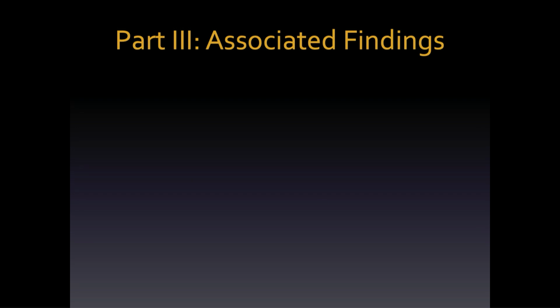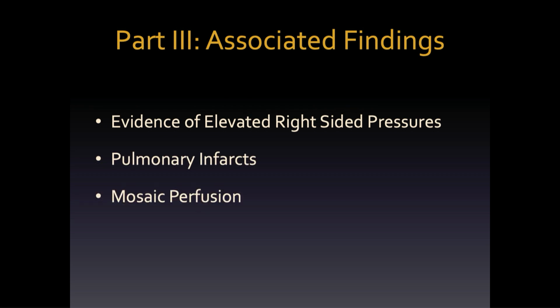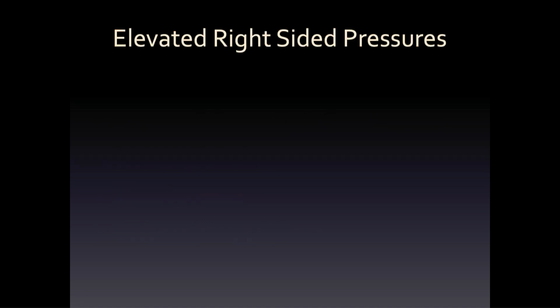All right, next, associated findings. People love to talk about these. So there's a couple of them. Instead of reading that list, I'm going to go through them with you together. The first is, when do we get worried about the right side of the heart?